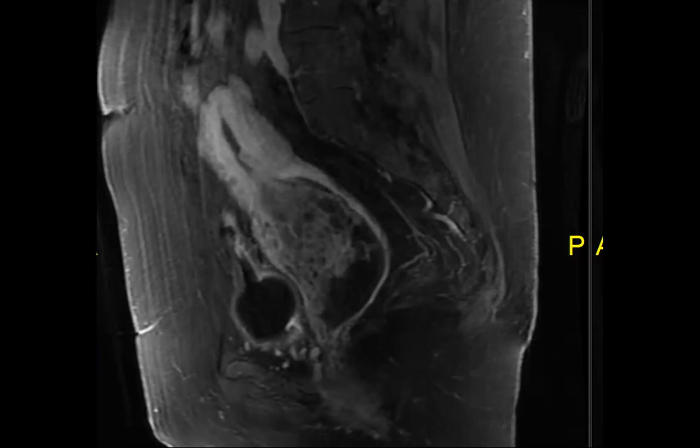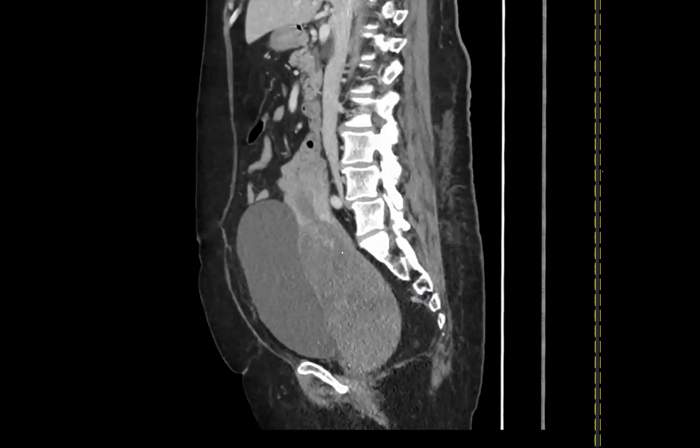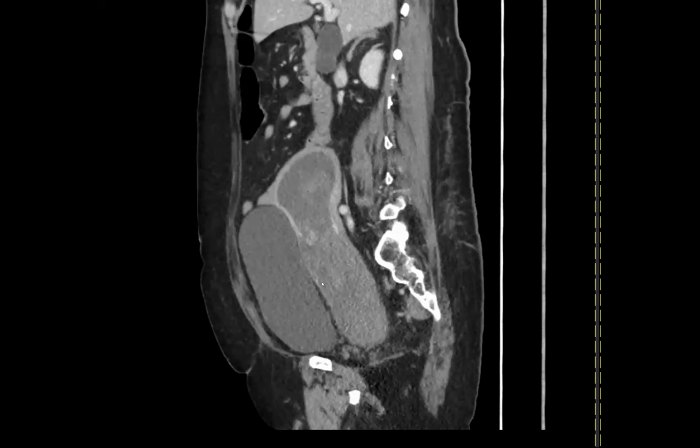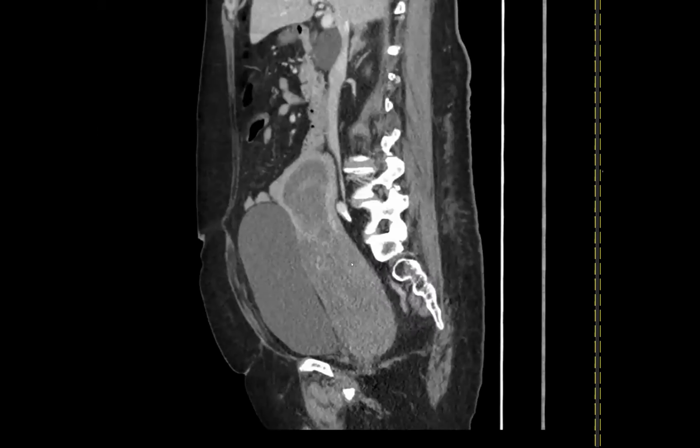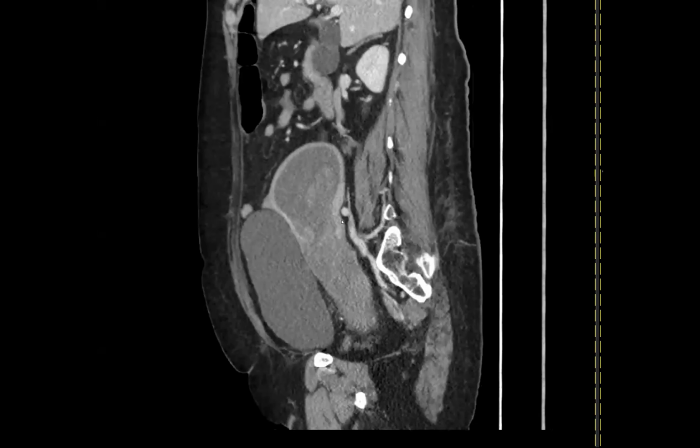Let me just get the CT. So is that what happened, it herniated? There's a polyp and it herniated into the vaginal fornices? Great. So it's a giant polypoid mass. You can see a giant mass which was there on the prior CT, centered in the endometrium. Now it's prolapsing down. You can see that the endometrial cavity is markedly distended by probably blood.